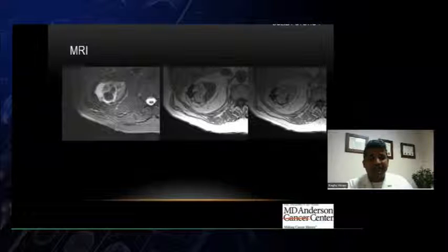Sometimes it's a little more difficult, like in this mass here. This is a lesion which was post-RF ablation, and then you come into more difficulties. On MRI, you can use this as a problem-solving tool. As you can see here, it has low signal on T2 and some high signal peripheral areas. Once you give contrast, you really don't know; the extreme right image here is the post-contrast image.